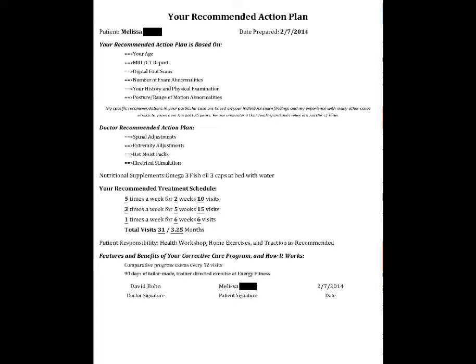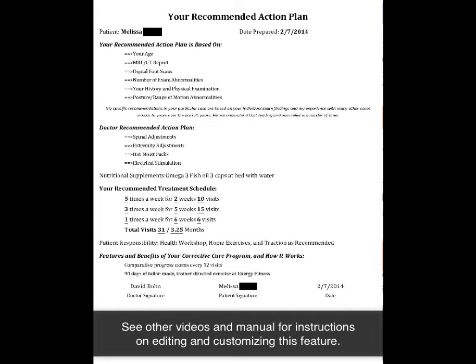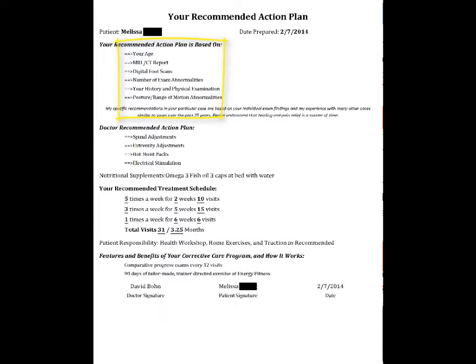Now, another nice feature with SpineTech is that it includes the ability to put in your own custom recommended action plan. What I mean by that is that everything on this page can be edited and changed so that you can quickly click down. Your plan is based on your age, your foot exams. Maybe you do an AK analysis. Maybe you do a digital spinal electro analysis. Whatever you want to put in here, you can change these so that you could have 100. And when you go down on the template in the software, you just click the ones you want, check them off, and it only prints the ones that you've checked. It puts it into the report.